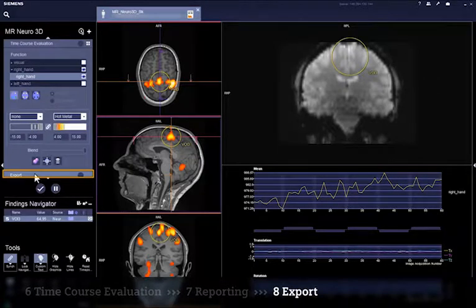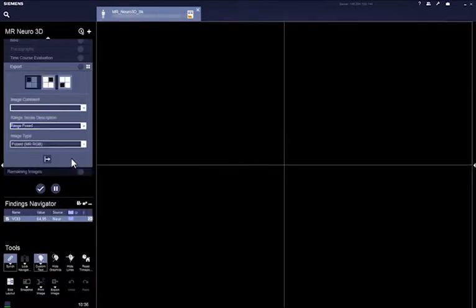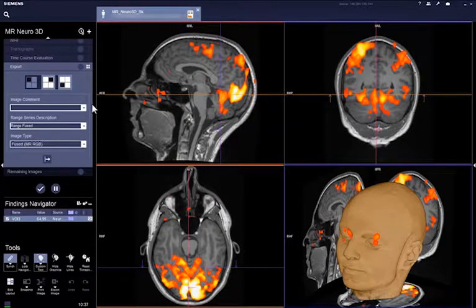The export step is used to export the processing results by creating ranges of the activation maps fused with the reference series. These results can be stored in the PACS in different formats, enabling later reuse for surgery planning. To export the complete series in specific orientations, the desired segments to export have to be selected together with the format. Pressing the export icon triggers the export.